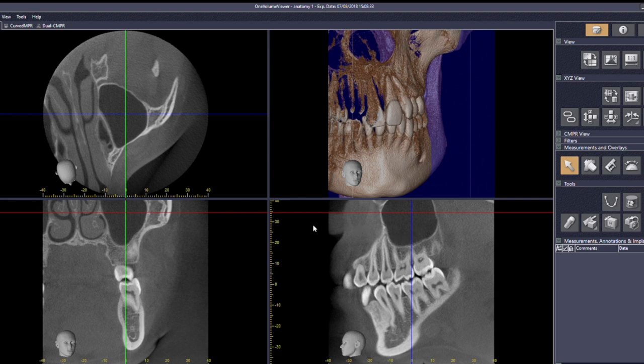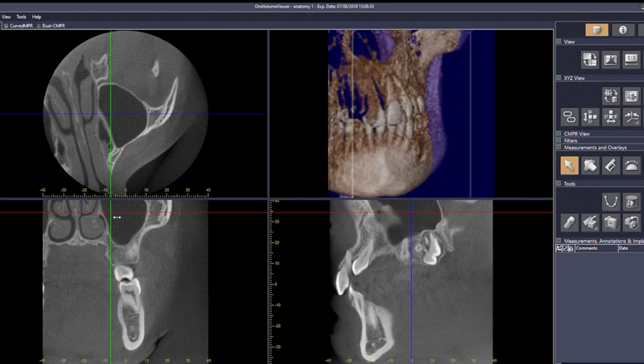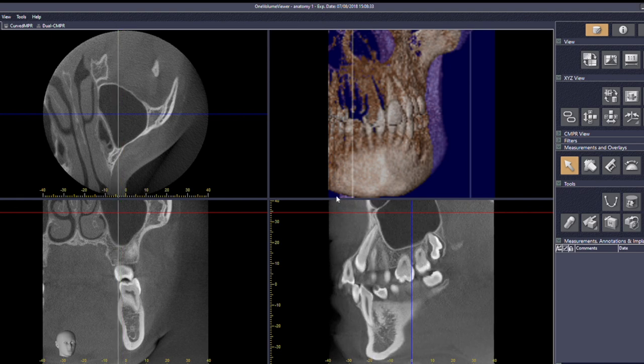That's really important because those natural curves will tell you if something is distorting or deforming them. And as I move around, you can see that we get a lovely picture of the antral outlines intact. What we've got is a little septum, totally normal, allowed to be there. You often get antral septa. This will be very likely incomplete, i.e. it will end somewhere. It's unlikely to entirely divide up the antrum.